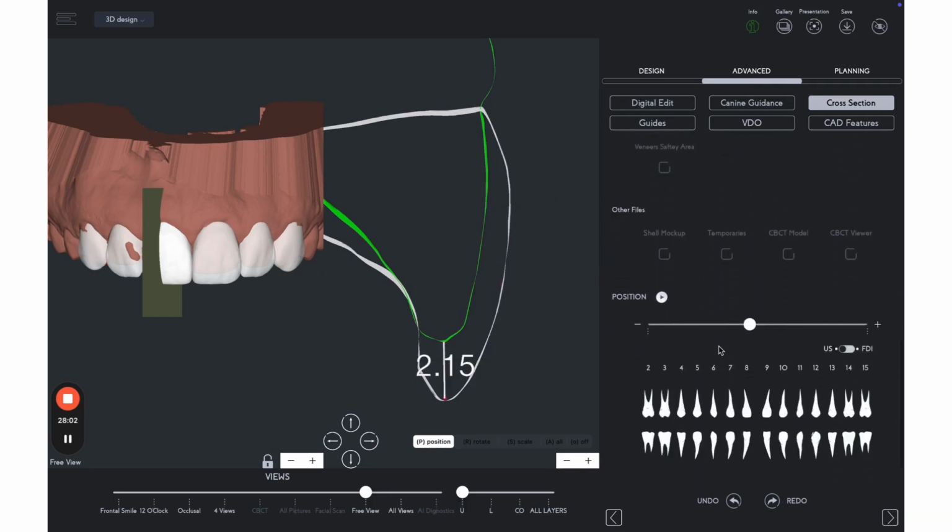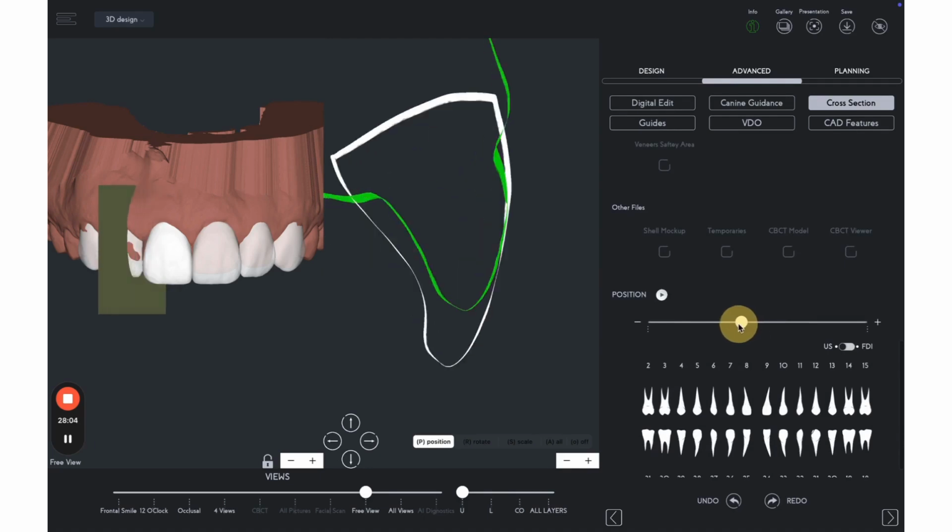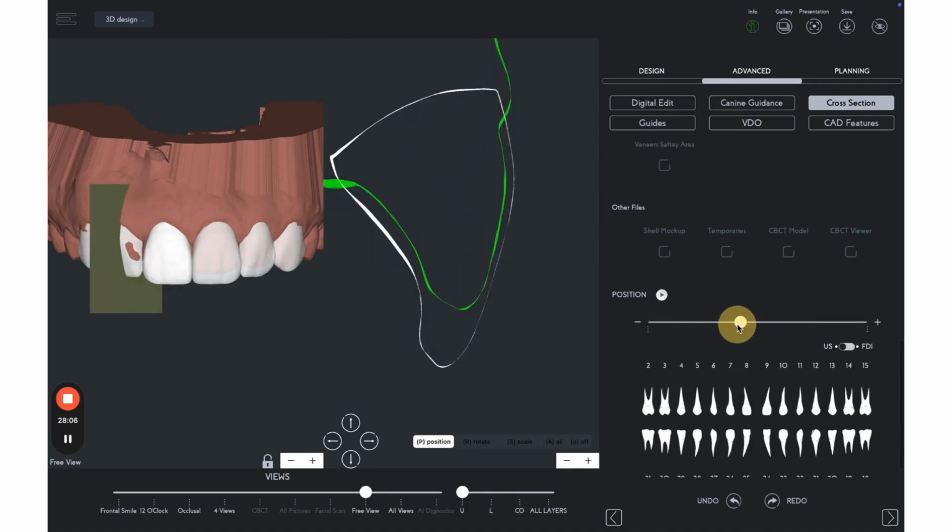It is also great for gingivectomy if you're trying to measure how much. For example, here we're going a little bit over the gum contour. So again, if I want to measure, it would be from here to about here, which is 0.4. Now, of course, in this case, we're not going to do any gingivectomy, and I will be removing this extra part.